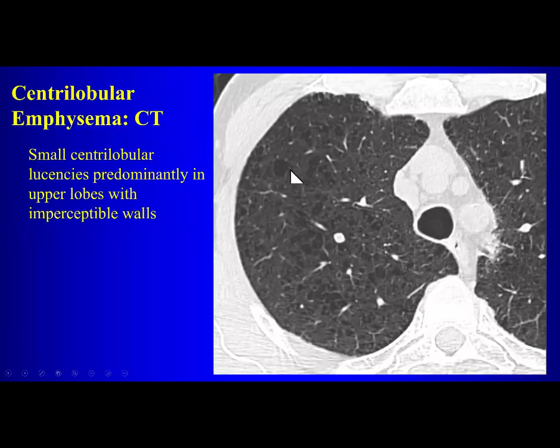Okay? So you have these holes. How do you differentiate emphysema from lung cysts? Wall thickness. Wall thickness, right? These have imperceptible walls. Cysts have thick walls or perceptible walls. So these are imperceptible walls, right?